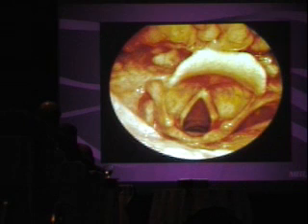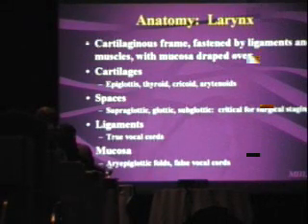We're getting these scans for 2 reasons. One is, normally the laryngoscopy can't see the subglottic region as well, what's hiding under the cords. That's a blind spot. And number 2, because they know that cancer's there, but they want you to stage it. That's the reason that you're getting these. Okay?